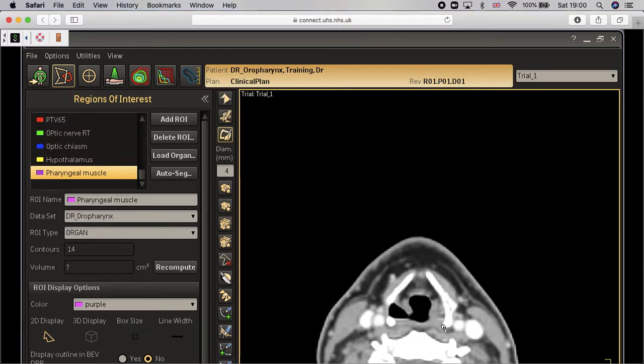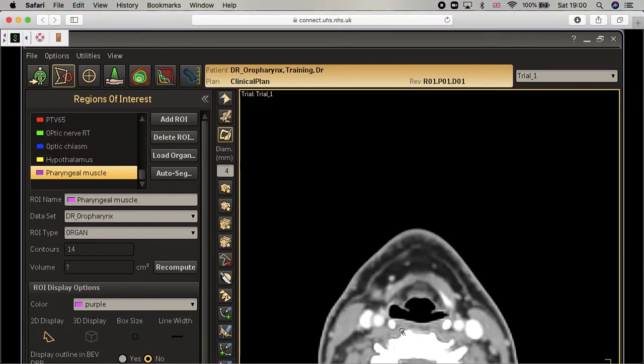and in practice, or in reality, we are talking about two different. So it's easy to delineate it because you can see it's just in between the thyroid cartilage. You don't have to extend beyond, and so it's easy to say that this is the pharyngeal muscles, and it's easy to delineate it, honestly, at the level of the larynx. It's very easy.